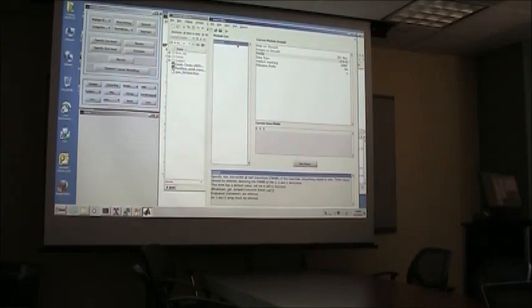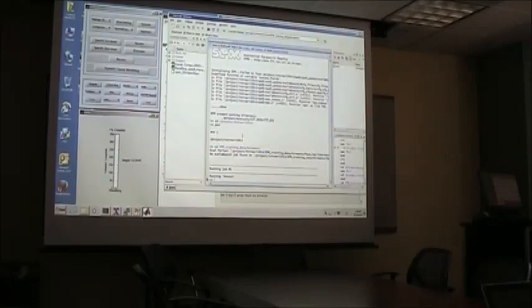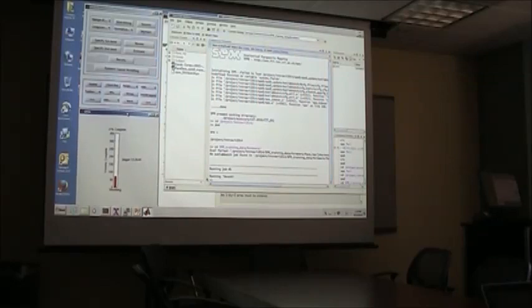Last week we talked about how you can run this within SPM by pressing this button. So let's just do that again. Now SPM starts running this job. What it's doing right now is making sure that high peaks in the processed images get averaged a little bit by their neighboring voxels. So your data gets smoother and more valid for statistical analysis, and you increase the signal to noise ratio by doing this step.